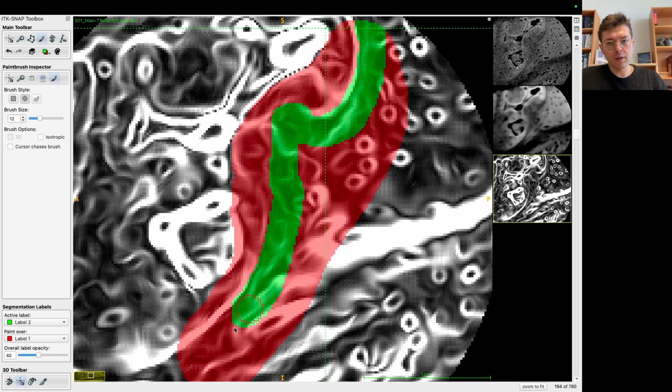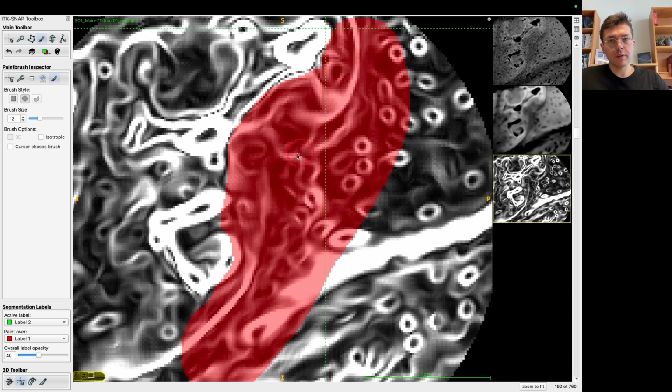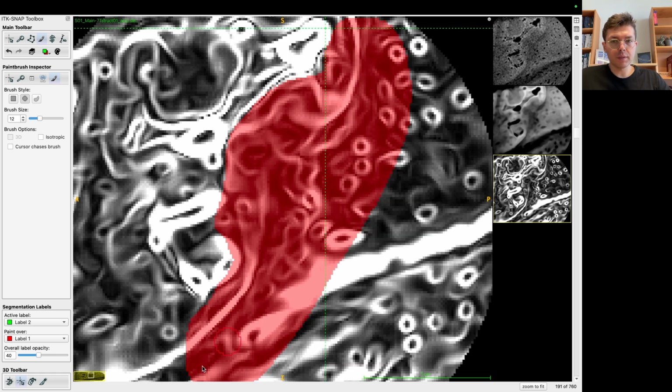This one is really hard. I have to say that my images that I did get here in Maastricht, and the more recent ones with 3D EPI instead of just GRE, look a bit higher SNR than these. I could see the boundary more clearly there. So there is definitely a bit of a noise issue that we are struggling with here.